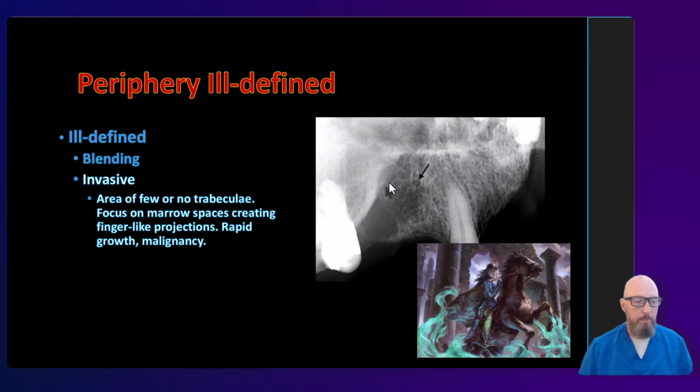Often it's a hematopoietic malignancy. This is a lymphoma in an older patient. But just for now, recognize the sign, recognize and be able to describe this as ill-defined. And you might go as far as to describe it as invasive.